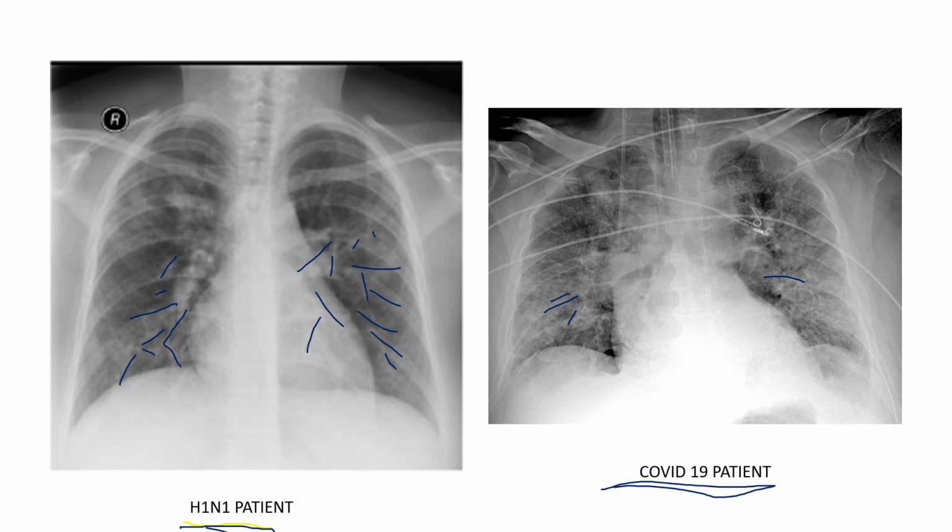It attacks the lungs altogether, and it can make for a really, really bad situation because you have inflammation, swelling, and effusion and pus that's going into the respiratory zone, causing all this white, hazy looking stuff. And that white, hazy looking stuff represents a hard time getting oxygen to diffuse into their bloodstream. And so this is why we have big issues here.